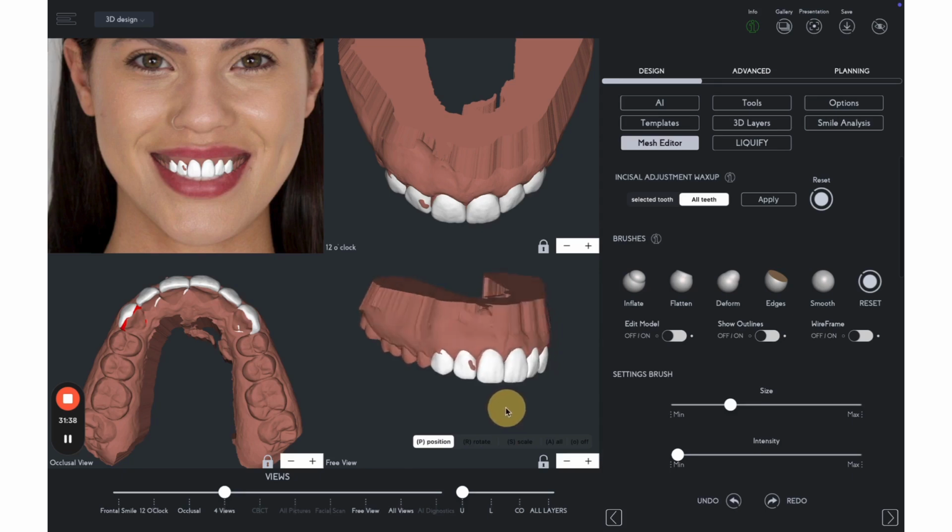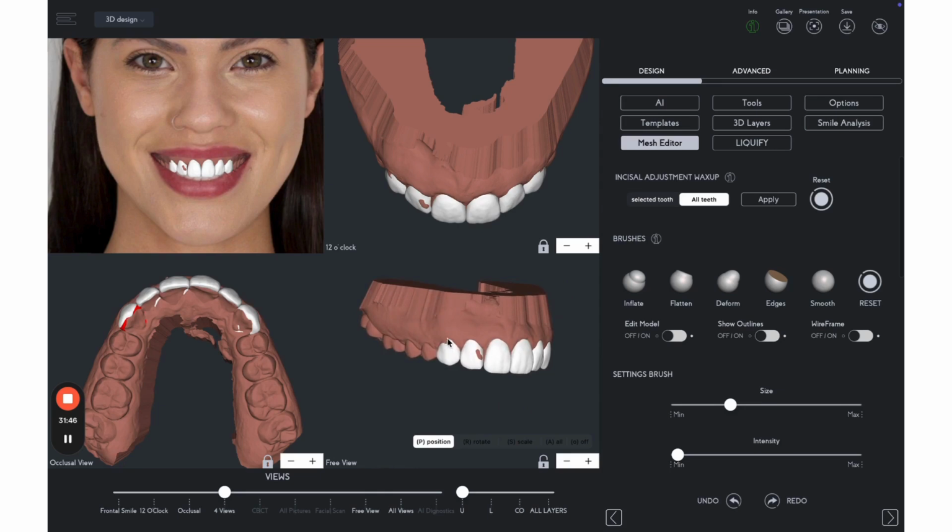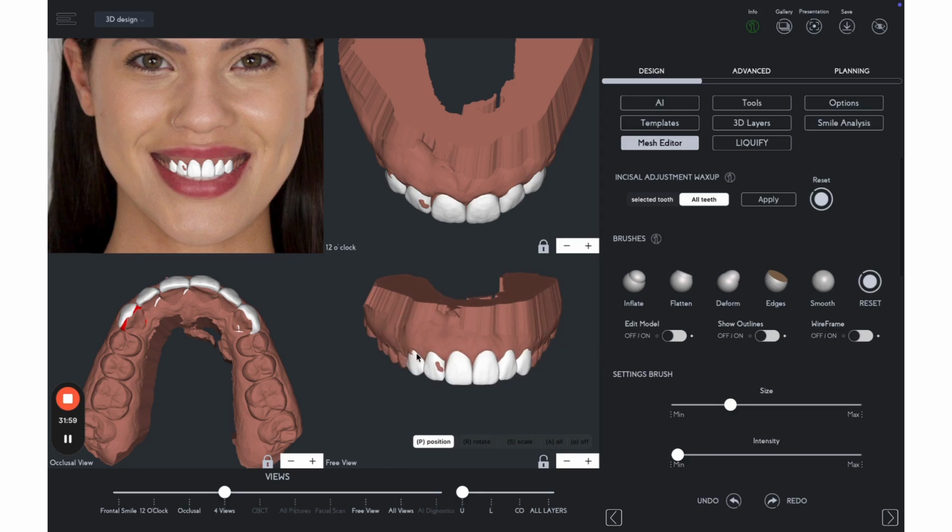Okay, so this is how it looks. Still some adjustments that we can do. Whenever the template didn't fully cover the existing tooth, it doesn't necessarily mean that we need to prep this area. It simply means that we have to customize it to our existing teeth. So here I'm going to add a little bit more with the brushing tool now.